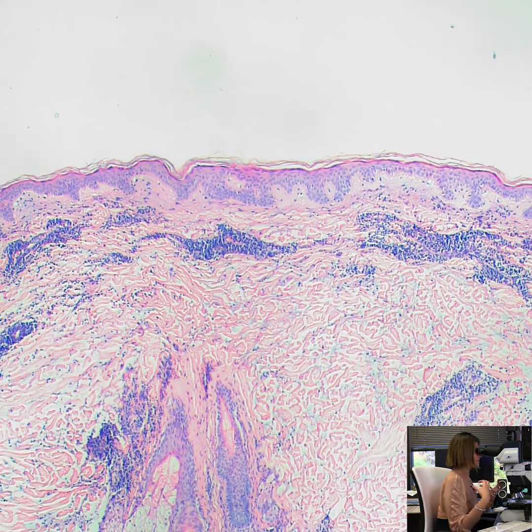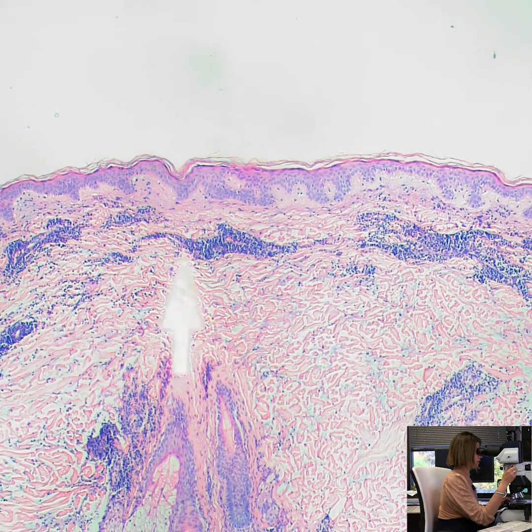They typically don't present with the classic lesions of lupus as you would see in discoid lupus or subacute cutaneous or systemic lupus. However, the histology of Tumid lupus is really classic. What we see here is a superficial and deep dermal perivascular lymphocytic infiltrate with also perifollicular inflammation.